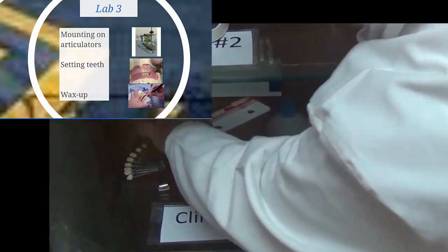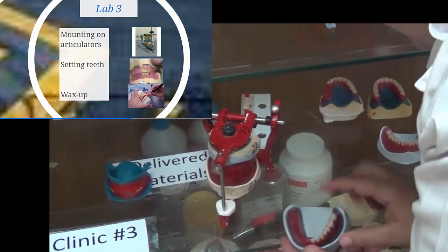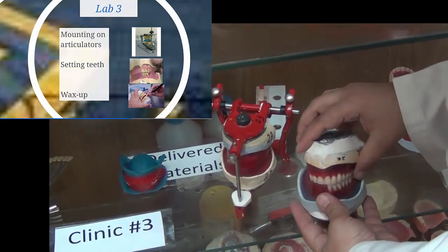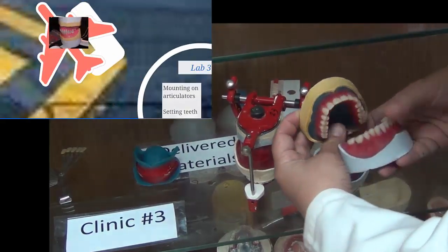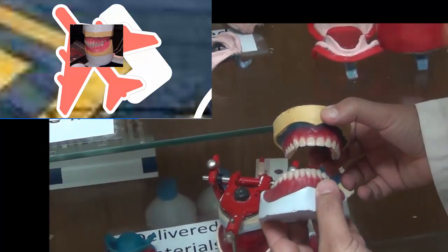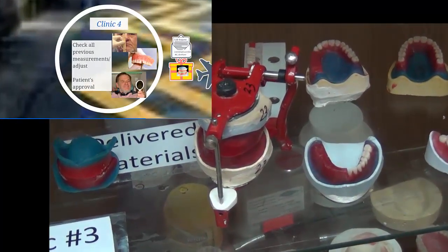So the technician will bring a set of acrylic artificial teeth, using the same shade that the dentist recorded, and then we'll begin setting the teeth, upper and lower teeth, in location and in occlusion. Once all of the teeth are set, we now call them trial dentures. These are not actual dentures, these are trial dentures, meaning that they need to be verified and checked inside the patient's mouth. And these are the results of lab number 3, a trial denture.